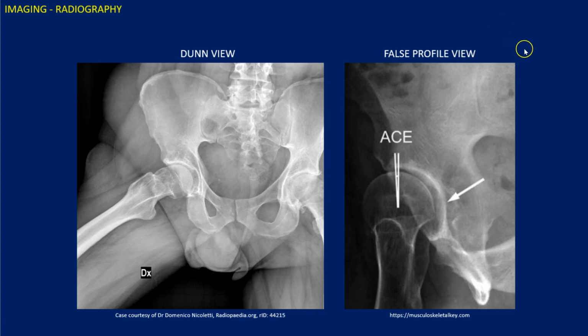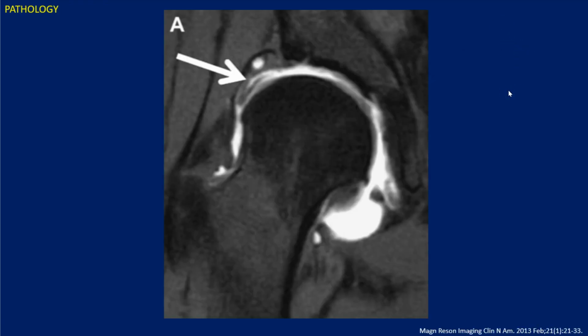As far as imaging pathology of acetabular labral tear, I'm going to show a few MR, including MR arthrography and ultrasound cases. In a typical or classic sense, this is what will be seen in a degenerative acetabular labral tear. One, there'll be contrast dissecting through a cleavage plane of a degenerative labrum that you see here. And two, very commonly, there will be associated collections outside of the labrum.